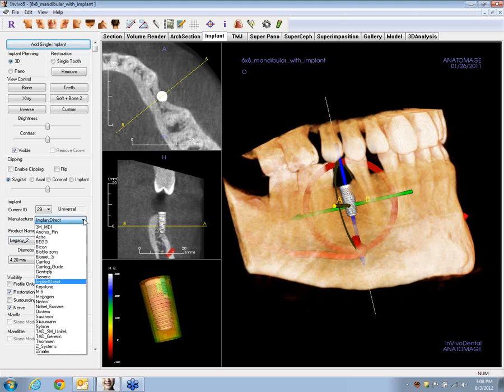can go ahead and change that implant to anything from a big long list of implants within the implant library here. So we can go ahead and set that up to be whatever it is that we want to use. And again, part of what we're going to discuss on the 14th is that customizing this library is an important part of streamlining your process of tailoring things from an inventory management standpoint so that you aren't caught short when you begin to plan an implant.